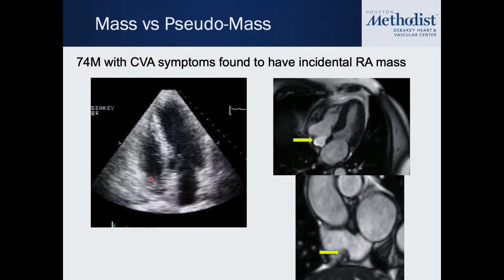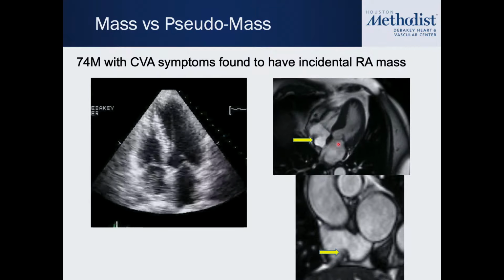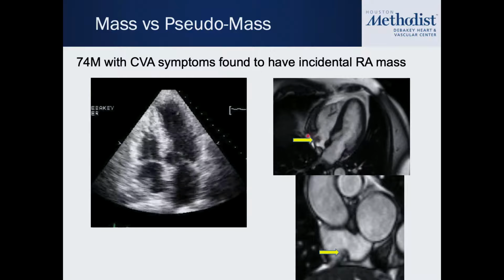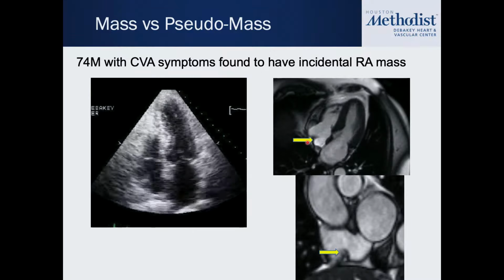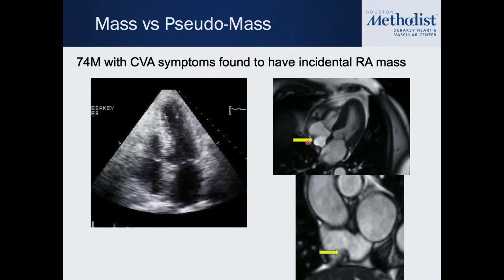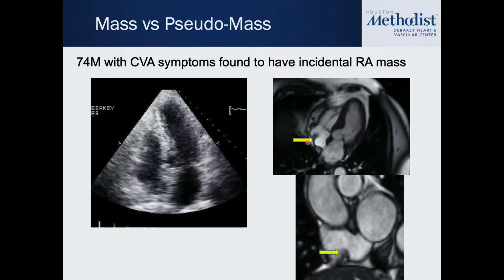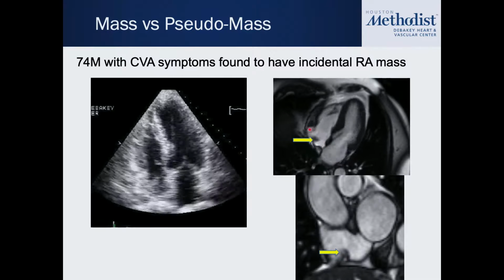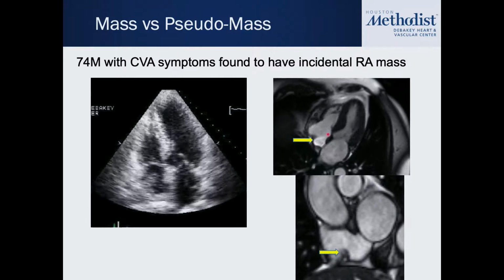So you can see now on the MRI, on this particular slice, how it fits to the contour of the IVC over here. The crista terminalis is this fold in the right atrium at the continuum of the SVC and the IVC inside the right atrium. So you can see here how it fits; you can draw a circle here of the cross section of the vein, right?